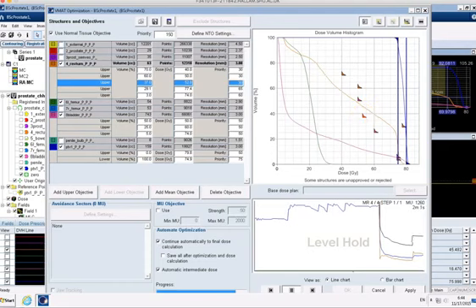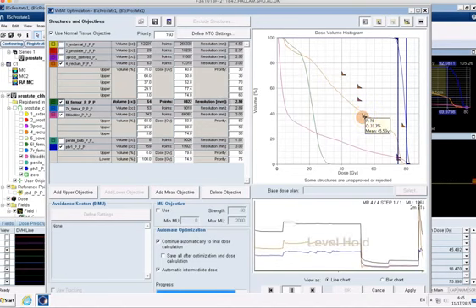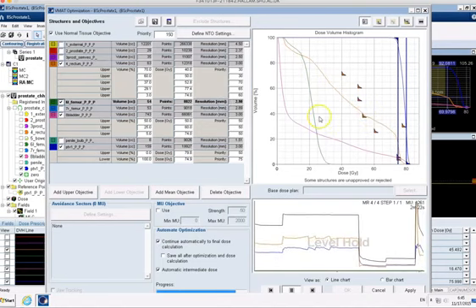So it's very much that process of changing those numbers and changing your priorities to find a compromise to the puzzle that works, because essentially that's what it is. If I was to, for instance, change that all the way up to 70 maybe, then that would straight away, hopefully, can you see it's trying to meet that point, because I've now said that that's really, really important. So have a play with that, and we'll have a chat as a group about how to optimize our plans.